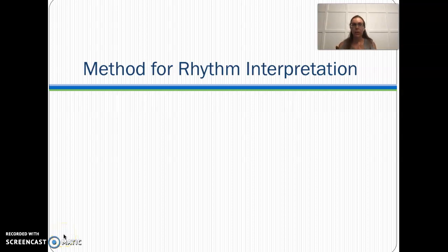So far we've talked about how the heart conducts electricity, how it moves through the heart. We've talked about how that shows up on your P, your QRS, and your T. And we've done some measuring with those boxes and things. And we know the normal range for PR interval and for a QRS complex. So we're moving right along.